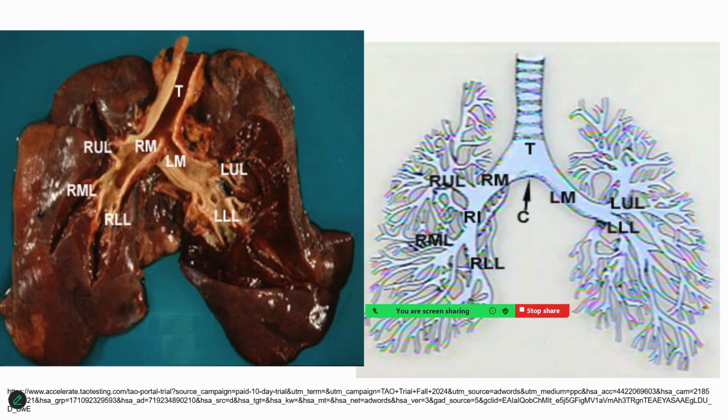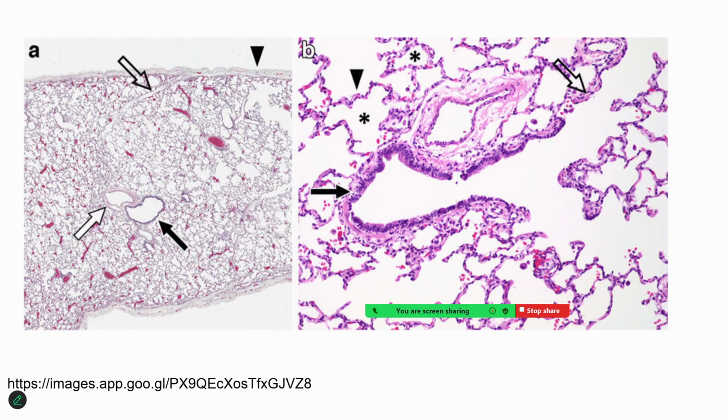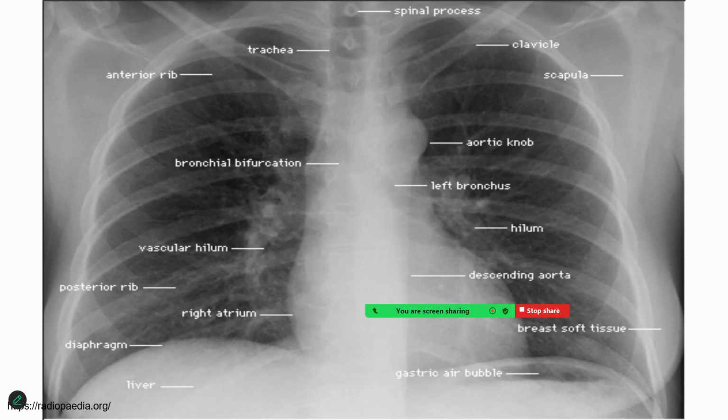Of course, I will not go much into that issue now. We'll directly go into the issue of diseases. Ultimately, the finest part of the lung tissue is the alveoli, where you will have a single layer of epithelial tissue containing air, and this would be seen in an X-ray image. So, with this very brief about the basics of the anatomy, I'll directly go into reading of a chest X-ray, or identifying this anatomical structure in a chest X-ray.